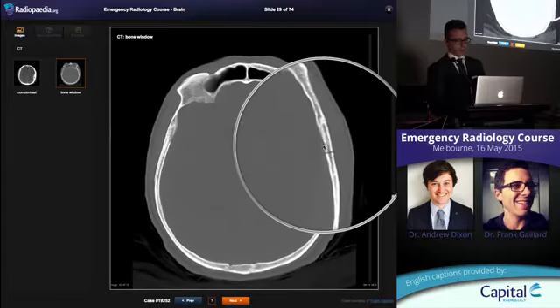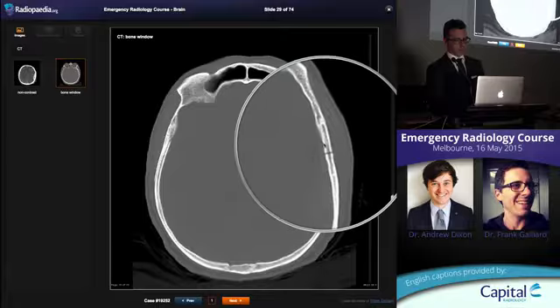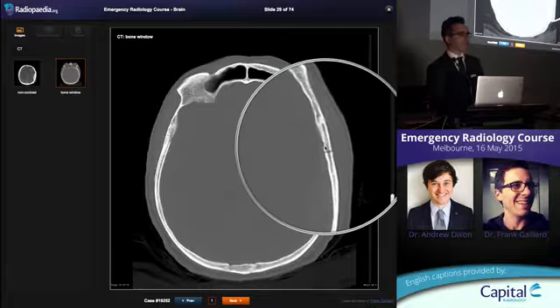That tiny little groove just there is the groove left by the middle meningeal artery. And the most common cause for an extradural hematoma is a fracture going through the middle meningeal artery and causing an arterial bleed. That's why their typical clinical presentation is they get hit on the head, they're transiently okay, but bleeding is starting. And it's starting to strip off that endosteum, the dura, and creating a mass lesion that gradually compresses the brain, and then they become drowsy and lose consciousness.